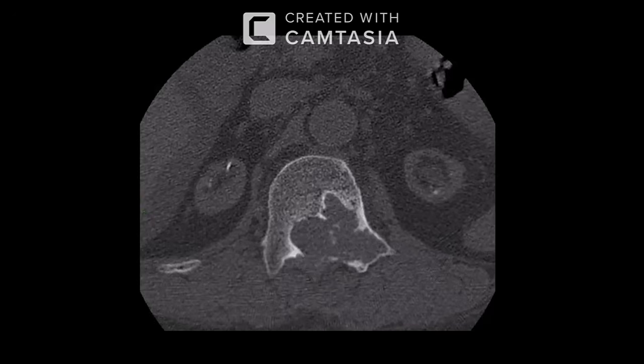Considering the bilateral small kidneys and presence of calcifications within, in my routine practice, I'll correlate this with the age of the patient. This appears to be an elderly patient, so my differentials would be first metastasis, then myeloma, and lymphoma as well. I'll inform these findings to the referring physician and will ask for CT guided biopsy of this mass for histopathology and further treatment and management of the patient.